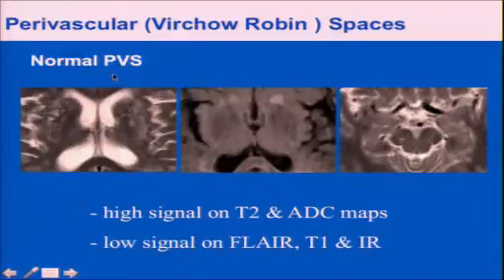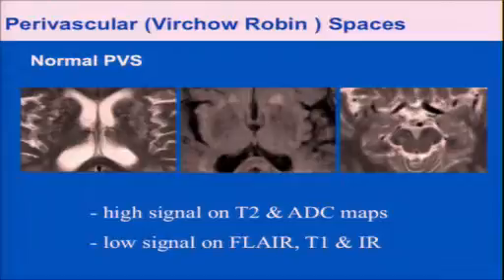The white matter lesions have to be differentiated from normal perivascular spaces, the so-called Virchow-Robin spaces. They are also common. Those are small CSF spaces surrounding the vascular structures, mainly in the basal ganglia, but they can appear everywhere in the brain. And of course, with aging, they appear more prominent because brain volume disappears and is replaced by fluid, and that happens in the outer and inner CSF spaces, as well as in the perivascular CSF spaces. So they increase in size with age.